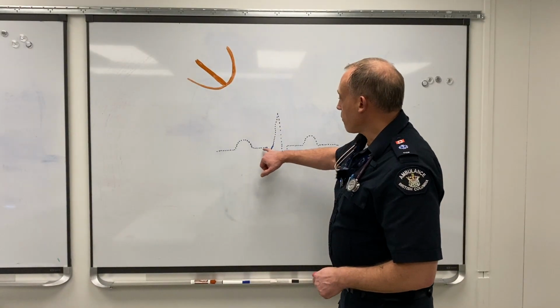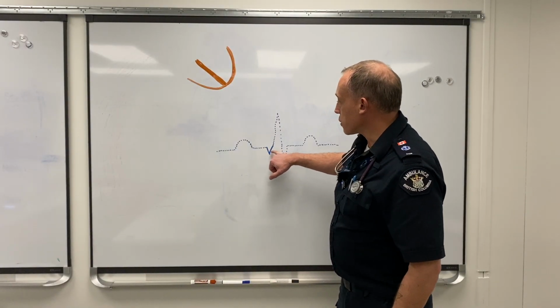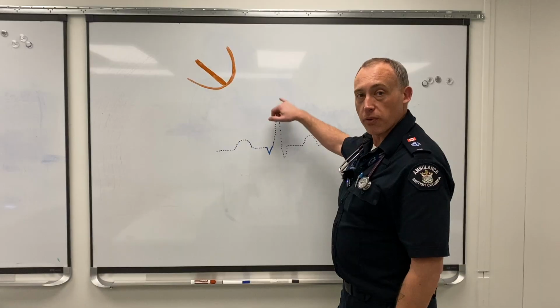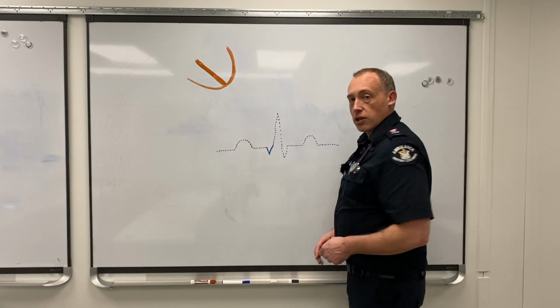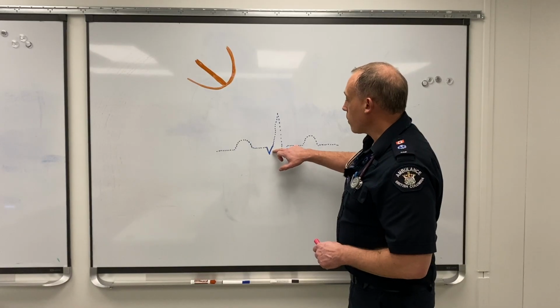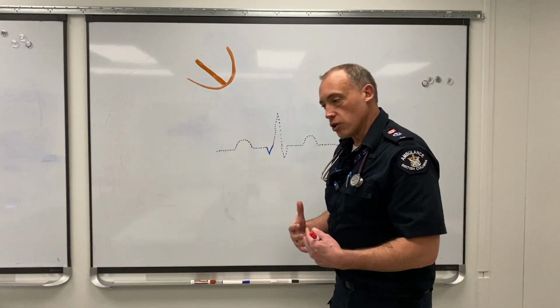So the Q wave in our normal ECG that we've been looking at in lead 2 is usually a small negative deflection that occurs after the PR interval, or the flat part after the P wave. The first negative deflection before the R wave would be called the Q wave, and we can see here that I've highlighted it in solid, as I have for the other parts of the ECG as we've gone through. So the Q wave normally occurs in a normal ECG where there's no pathology.